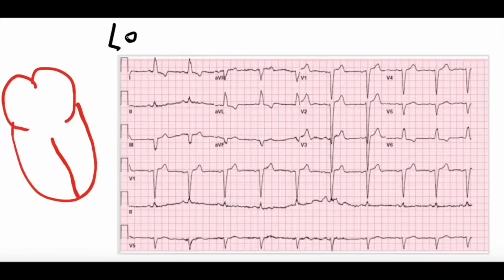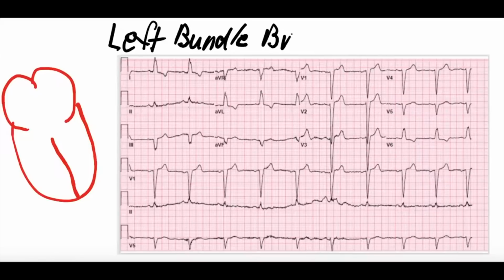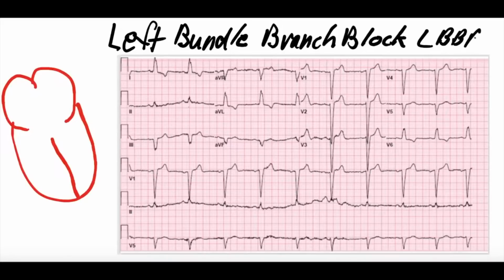Left bundle branch block. I could have just abbreviated it, but we wrote it out because we care. Okay, so I have a 12-lead EKG from a patient I've seen previously with a left bundle branch block, which we're going to use to demonstrate left bundle branch block findings on 12-lead EKG.